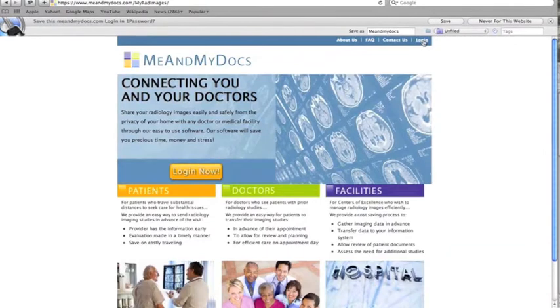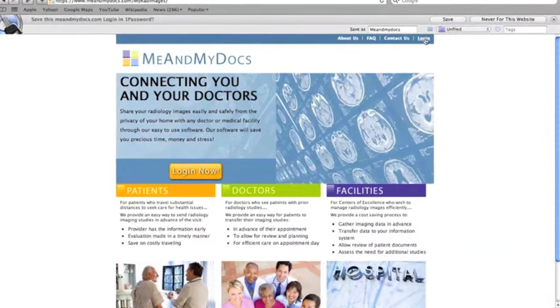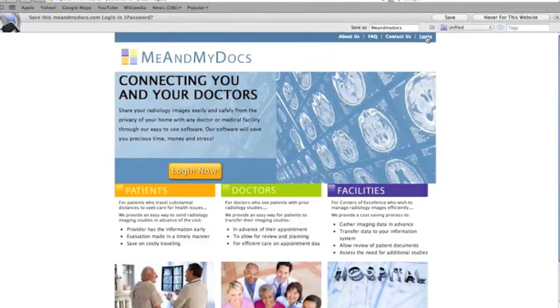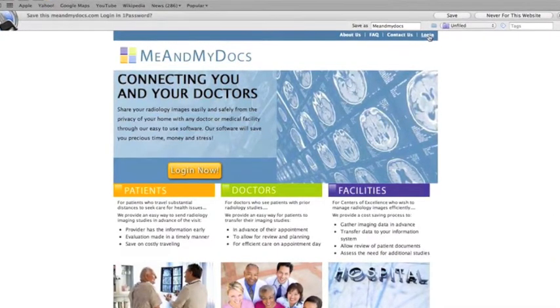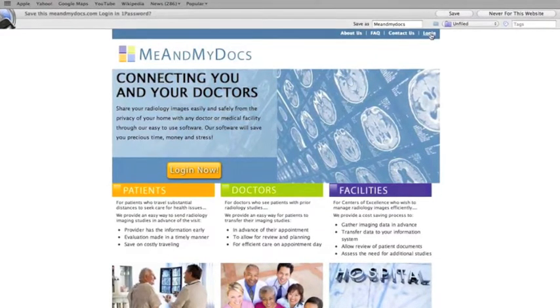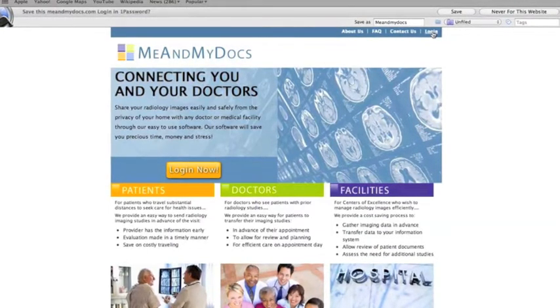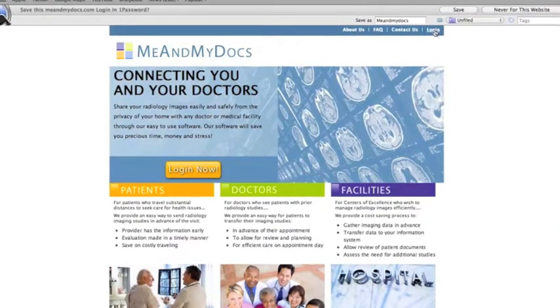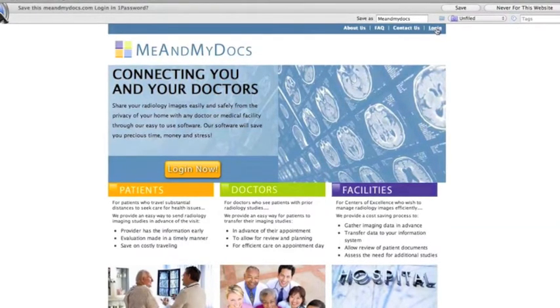This is a video tutorial for physicians, nurse practitioners, physician assistants, anyone who will be looking at these studies and then importing them to their radiology information system. So first we'll log in on the top right hand corner here, and then during this video I'll show you very briefly how our scheduler would send an invitation to a patient, what that patient invitation will look like, how the patient would upload their imaging studies from a CD-ROM, and then we'll skip to the part where you will look at these imaging studies, evaluate them, and send them to the radiology information system at your institution.